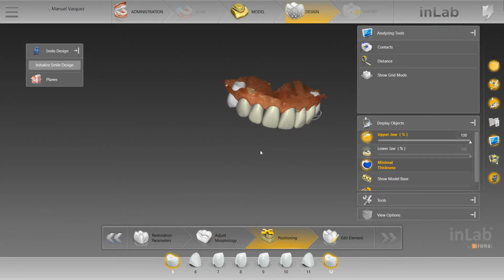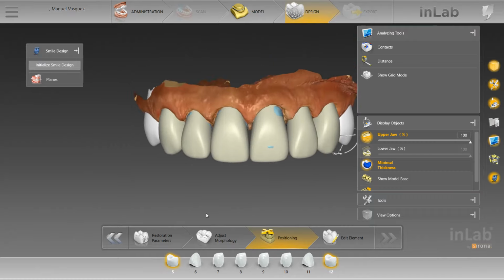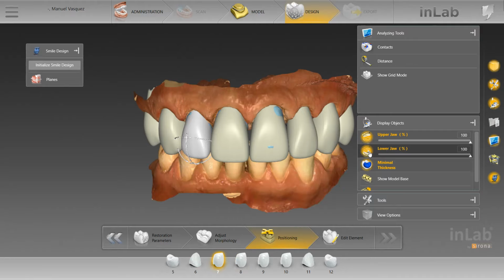All right, so these look positioned decent. Just things you'll notice right off the bat, these ratios or proportions between 7 and 10. The laterals look a little bit too wide. Centrals could be wider, these could be more narrow. So we'll get to all that, but let's pull up the lower jaw first.